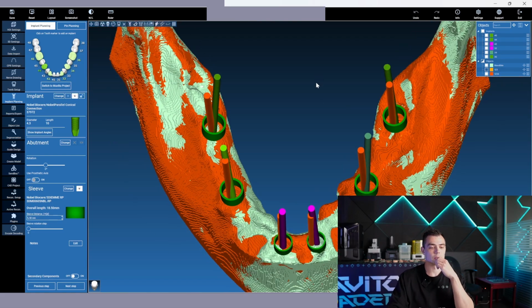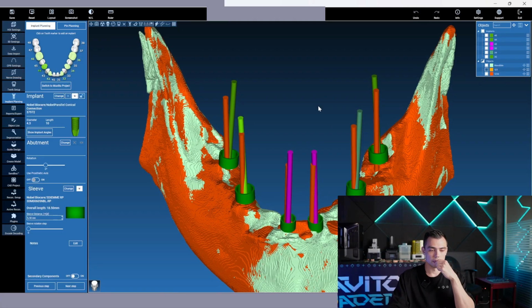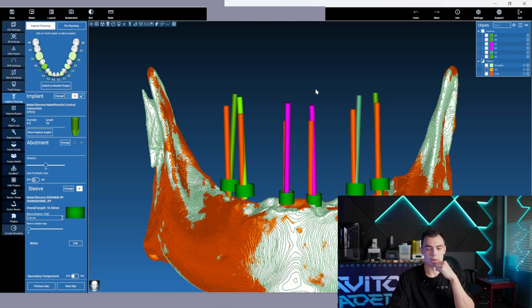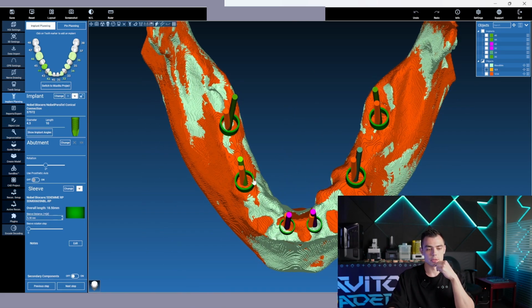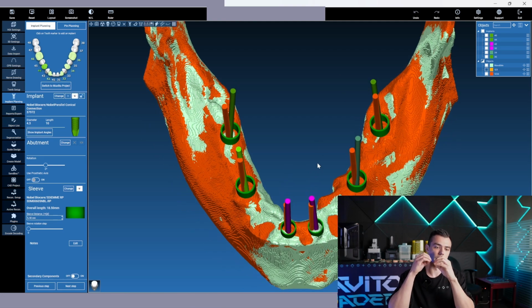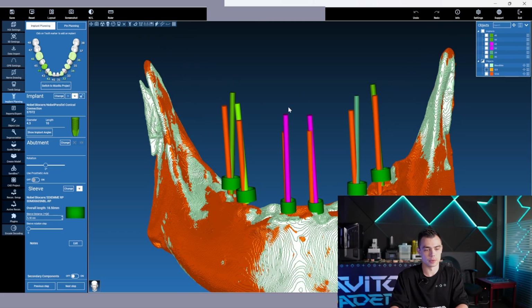That means that most probably the guide worked quite well. I mean, the surgical guide was successful because the areas of the implant insertion are absolutely the same on all of the 6 implants, but the insertion of the implants itself without a guided screwdriver brought about some mistakes in the positioning of the implants.